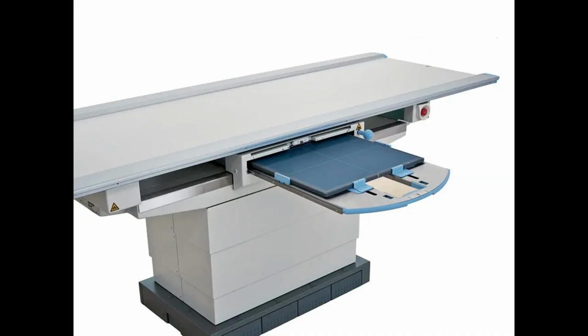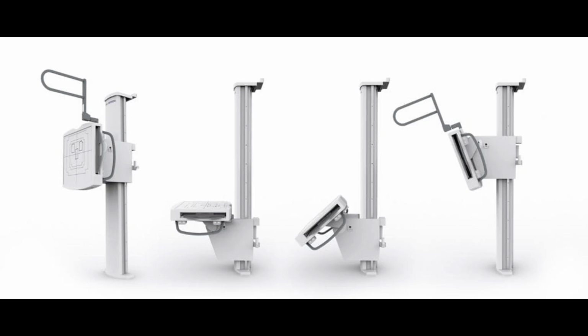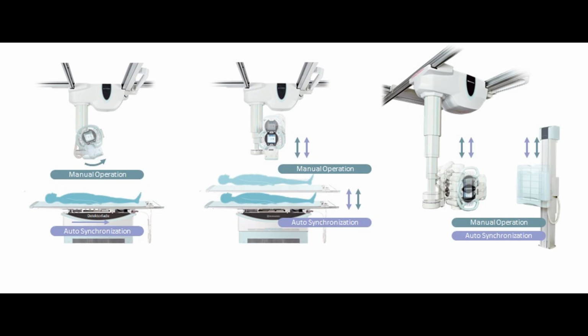In many facilities, mechanical issues with the table are among the most common causes of malfunction or repairs, and regular maintenance must be performed. 6. Wall stand. The wall stand is used for upright imaging, such as chest radiography, vertical spine exams, or studies where the patient needs to stand. The wall stand allows height adjustment and secure locking, so the detector or bucky can be positioned at the correct height. In wall stands, alignment between the tube axis and the center of the detector is also important to reduce distortion and image errors. For this reason, newer wall stands use synchronization capability.